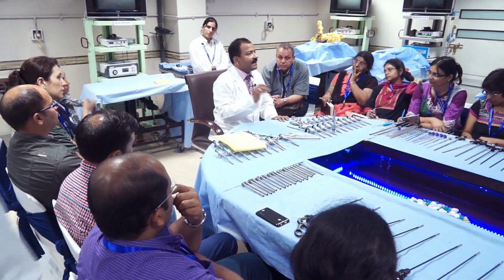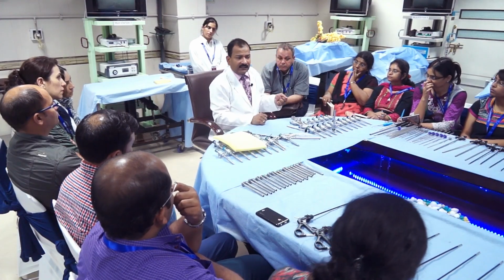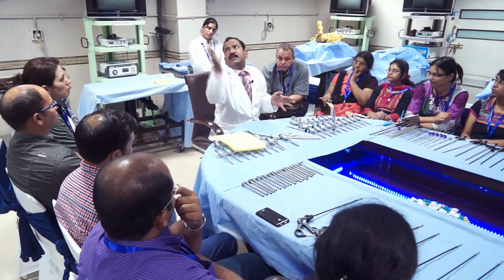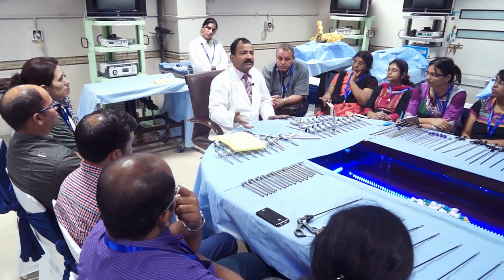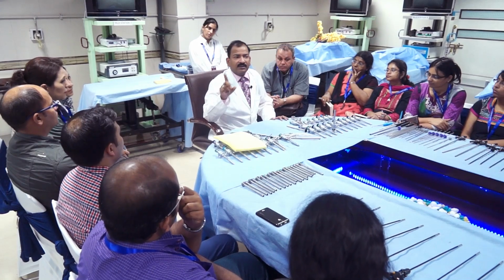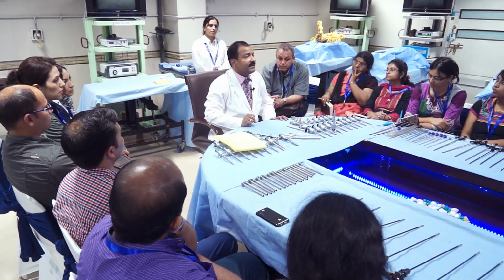Unfortunately, in minimal access surgery we are handicapped, we are blind. Our left hand is the assistant, right hand is the surgeon, and the camera person is doing the camera. And if you do something wrong, bleeding has started, everybody is smiling in the room. They cannot help you. They can only pass critics, because everybody is seeing what you are doing. So in laparoscopy, you have to be 100% accurate in the task analysis.